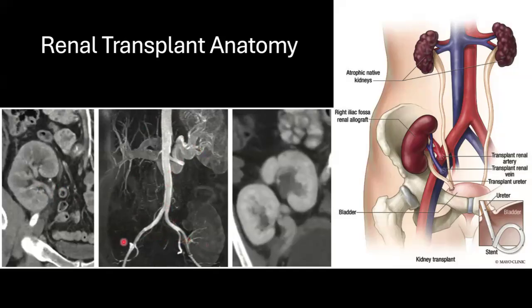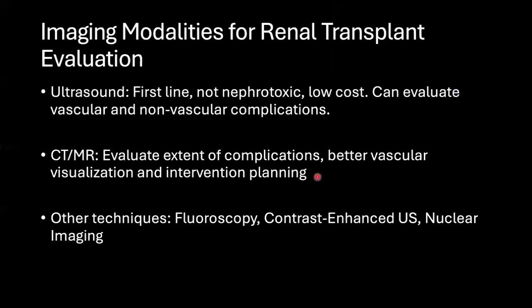And in normal anatomy, again, usually we prefer the right, but here is a case where they transplanted the kidney in the left iliac fossa, either from a failed right or due to anatomical constraints. And this is an en-bloc pediatric renal transplant where 2 kidneys were transplanted.